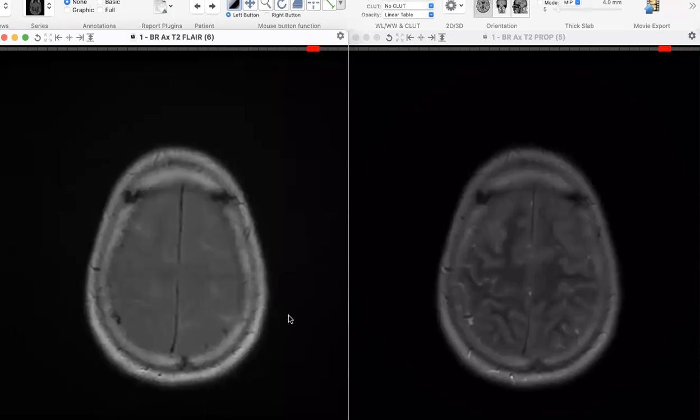What about this over here? What do you think this is? Dr. Wasif, could you please point out the radial bands again? Sure, no issues.